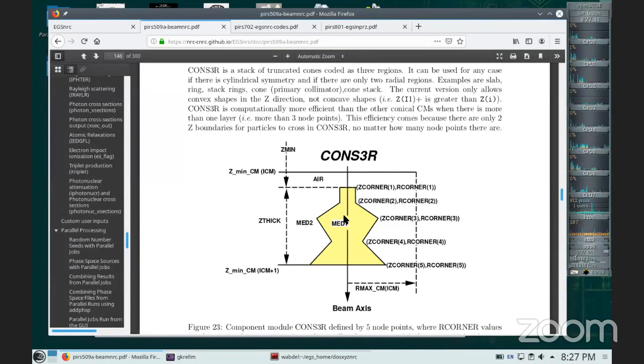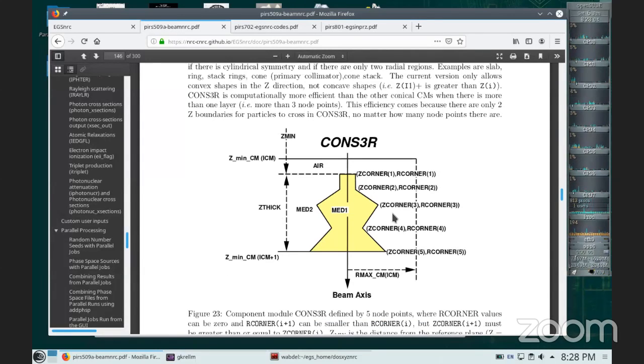So this is probably useful to model the primary collimator. The material inside is vacuum, and then the material here could be tungsten. This is something you get from the manufacturer, or you try to figure out what the medium there is, tungsten or lead, probably. Lead. I really don't know. But that is useful to model that geometry, okay?